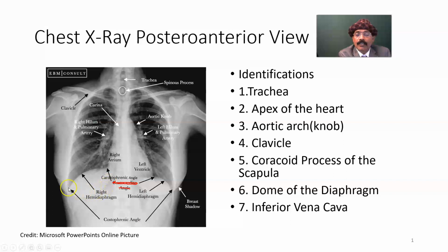This is the costophrenic angle, also called costodiaphragmatic recess. This is the cardiophrenic angle, between the heart and the diaphragm. Another one, cardiophrenic angle. This is the costodiaphragmatic recess or costophrenic angle. Okay, we got that.